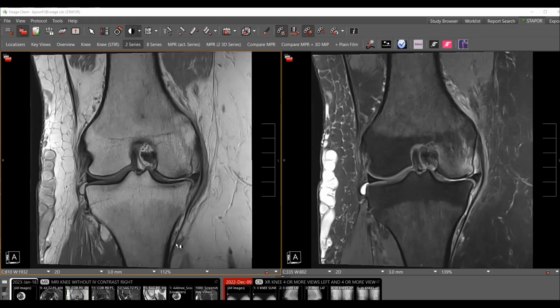When there is a large amount of bone marrow edema underlying a cartilage lesion, as in this case, it is very important to closely look for a fracture line in order to distinguish a degenerative subchondral bone marrow edema lesion from a subchondral insufficiency fracture, which is common in individuals with cartilage loss and especially meniscal extrusion in this case. Fortunately, this patient did not have a fracture line, which I could detect.